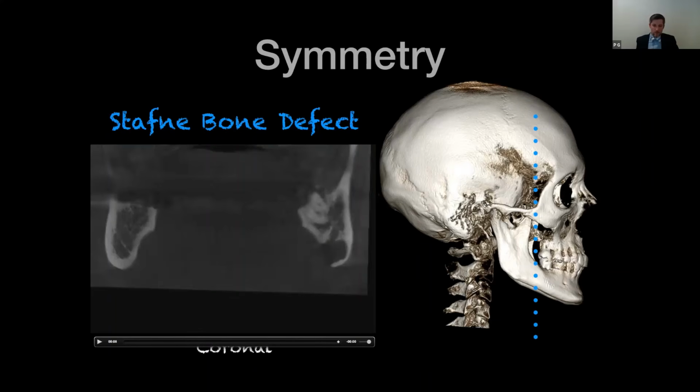It's most commonly found in this area, and it's thought to occur by pressure of that submandibular gland on the bone, and it actually forms a depression in the mandible. And so this would not necessarily need to be treated other than maybe radiographic follow-up at the patient's next recall appointment, in 6 months, just to see if there are any changes.